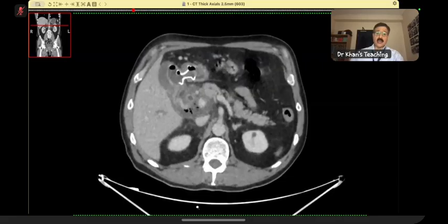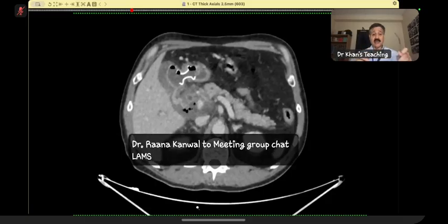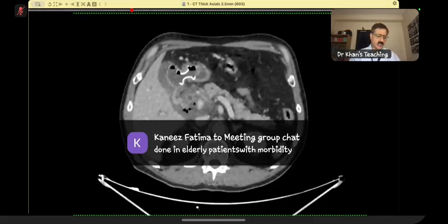In the FRCR exam, this happens whenever some new device comes along. By the way, it has been happening for 20 years. They will show you a device and ask what this is. So this is a very, very good case to learn something new. This device, if you Google it, is the Axios, Boston Scientific. It is a self-expanding stent with a very interesting shape.